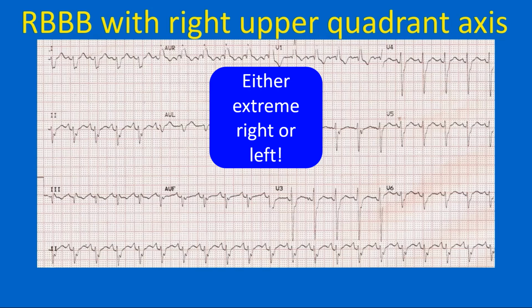Hence, it is rather difficult to say whether it is left anterior hemiblock or left posterior hemiblock which is associated with the RBBB. PR interval is normal. QRS pattern in chest leads show a clockwise rotation with S waves persisting up to V6. The slurred R prime in V1 and slurred S in lateral leads suggest delayed activation of the right ventricular myocardium, which proceeds by conduction through the myocardium rather than through the specialized conduction system of the heart.